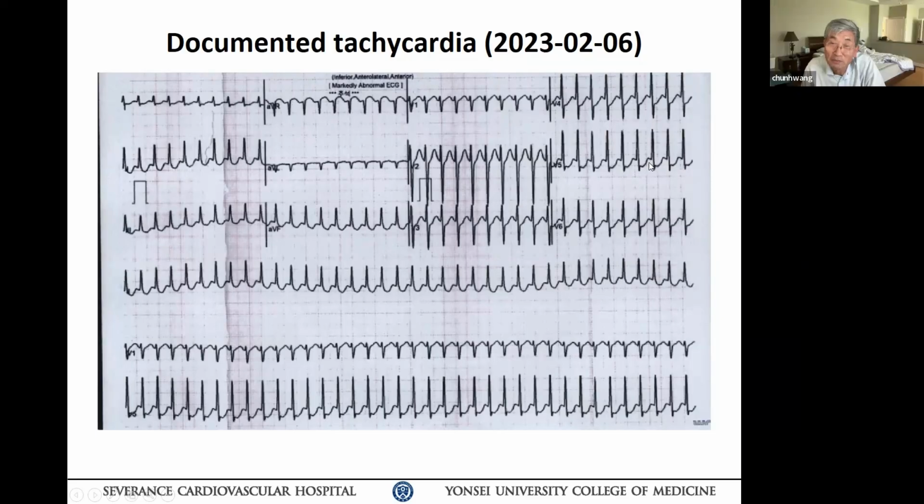I'm not sure that's a bump, but you should be able to see it much more clearly in the limb leads, because a unipolar lead makes P waves very difficult to see. So maybe aVF, at the bottom of a T wave? Maybe. But I don't see it in 2, 3 and aVF. In 2 and 3, I don't see anything really clear-cut.